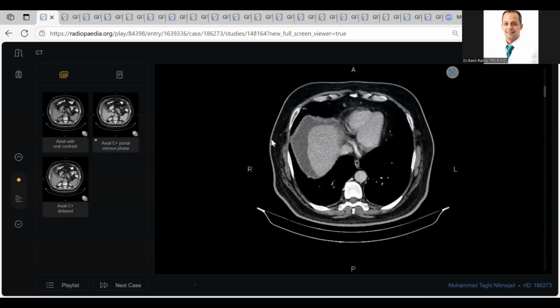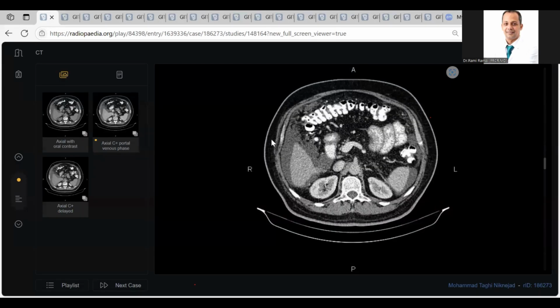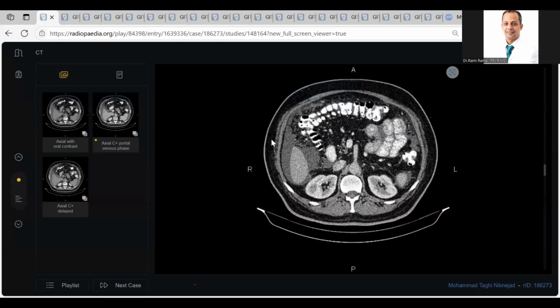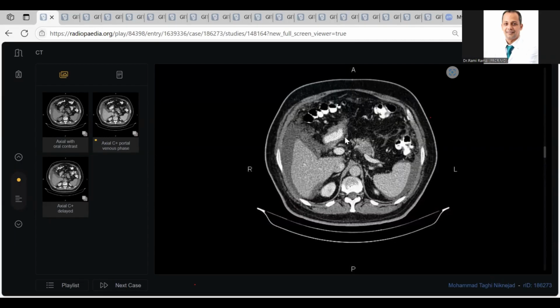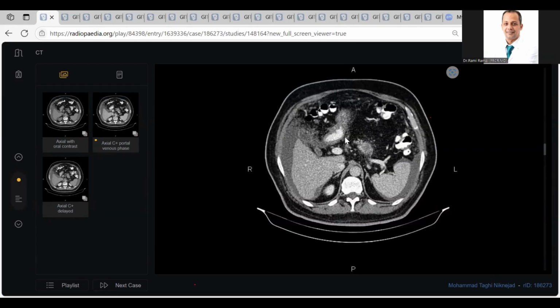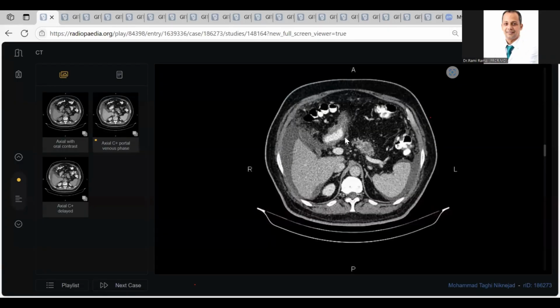It is very difficult to pick up a pancreatic tumor in an elderly patient due to fatty changes. Nearly the pancreas is totally fatty infiltrated. However, today, if you noticed, I'm bringing many pancreatic tumors to concentrate on.